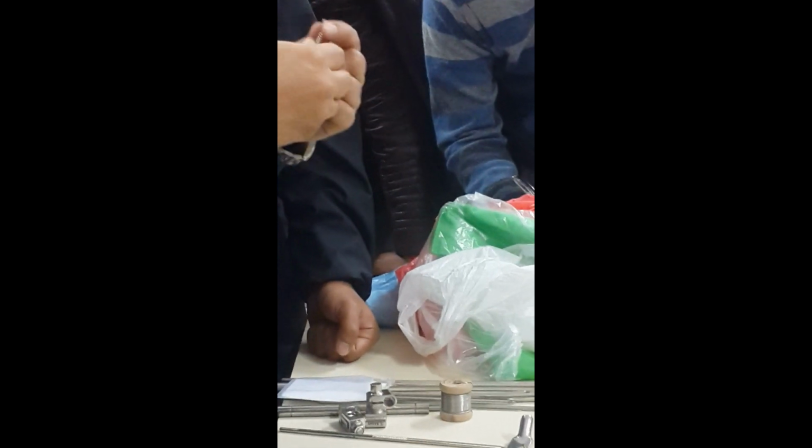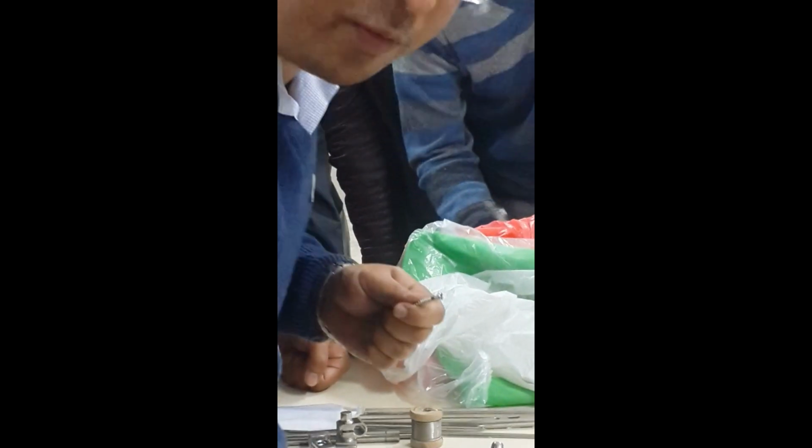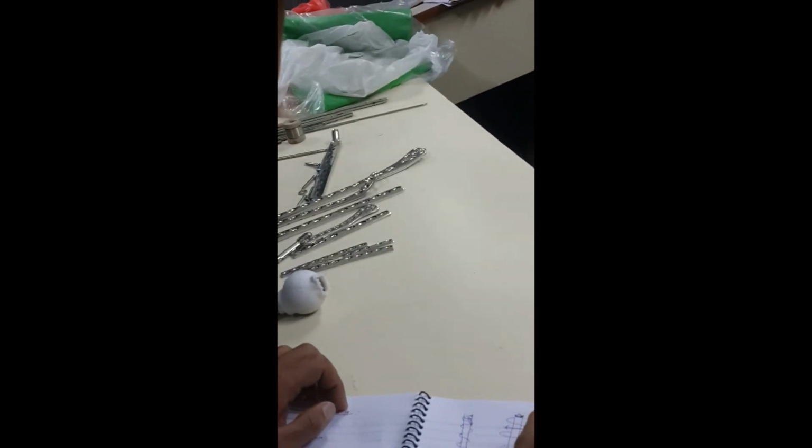Thread diameter and core diameter. In cancellous bone, the thread diameter is very much larger than the core diameter. But in cortical bone, the thread diameter is only a little larger than the core diameter. Core means the diameter of the inner rod of the shaft, and thread means the diameter of the thread. In cortical, the difference is very small, but in cancellous it is very much larger. So, mainly cortical and cancellous screws.